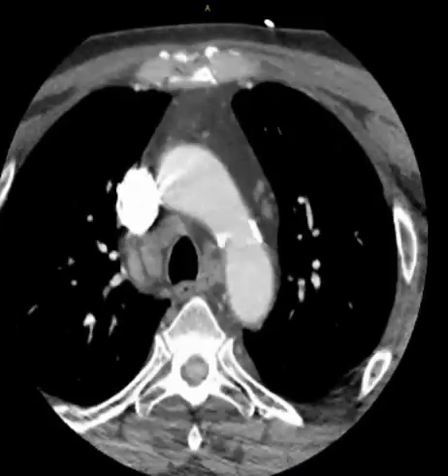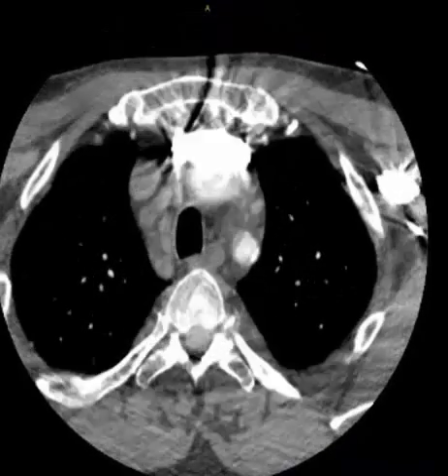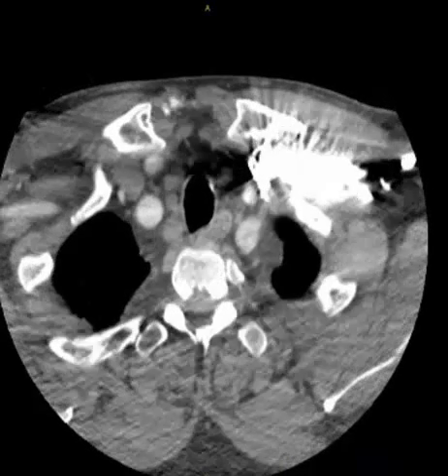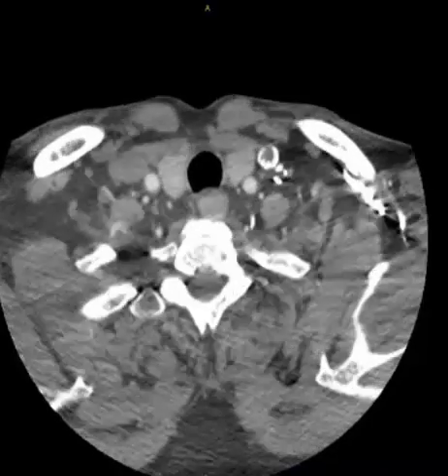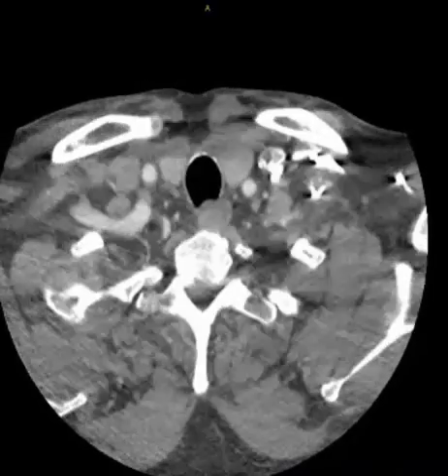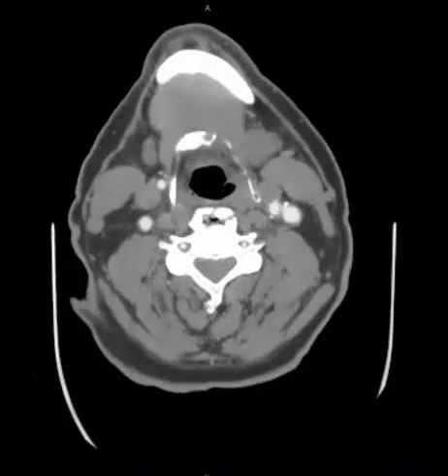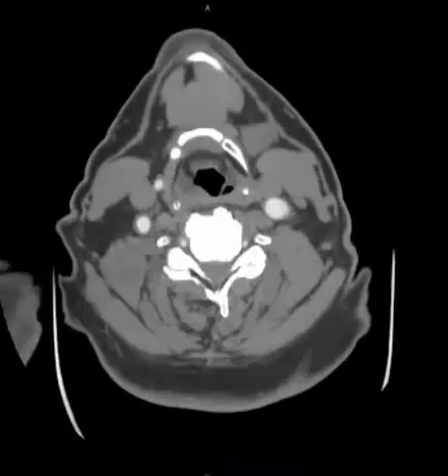And then I look at the aortic arch and see if there's any anomalous configuration and if the origins of the arch vessels are patent. In this case, it is normal. And following that, I check the origins of the vertebral arteries, of bilateral subclavian arteries, and then I move superiorly to look at the carotid bifurcations. In this case, there are mild atheromatous changes, but not causing critical stenosis.